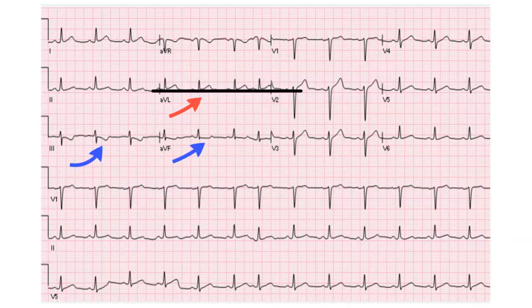And this patient, although it wasn't recognized, and you can understand why because it's so subtle, they also had a troponin elevation that went up to over 200 nanograms per litre. They also had an occluded first diagonal branch of the LAD. So that's high lateral STEMI in a nutshell. Follow these principles and you'll never miss one ever again.